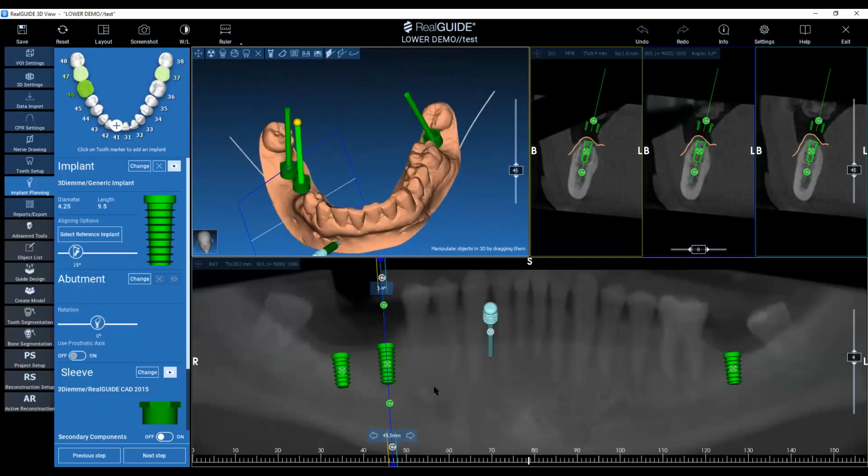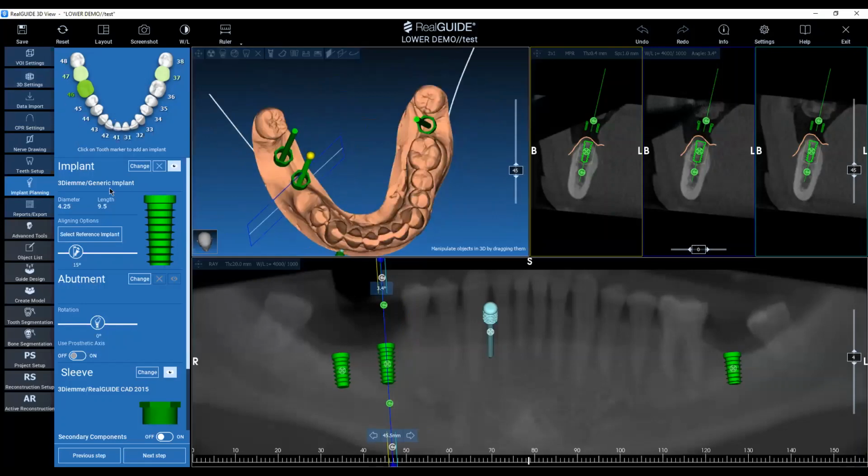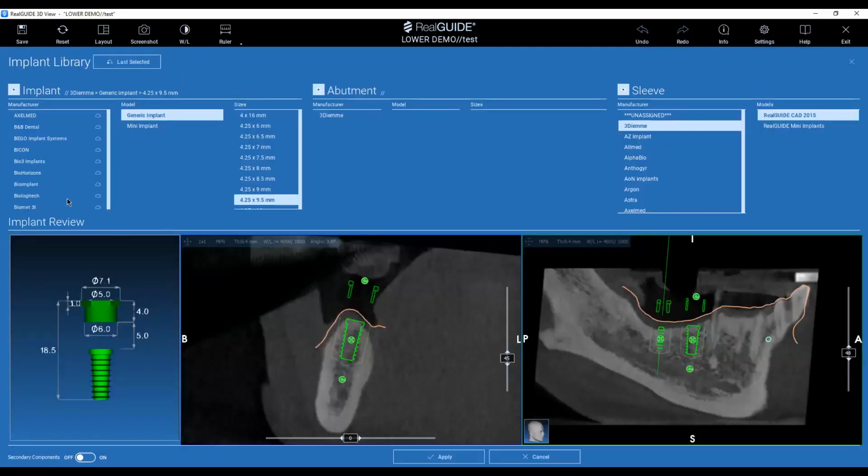Anyway, if you want to be sure if there is a report, you can try to download our software and, using the demo version, prepare a plan. You can choose the implant you want or the implant library you need.